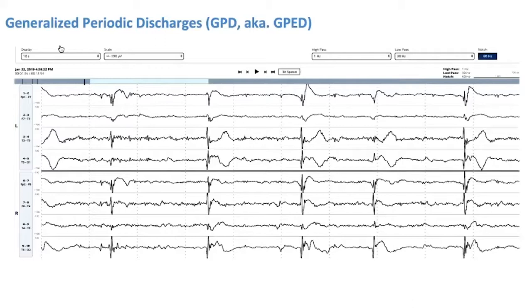It's not that a certain duration has to be met. They're not measurements that indicate one type versus another. It's the stereotyped nature of it. You can see 5 of them across this page. The interval is not as fixed as the other, but that's okay. It's the relative preservation of the interval and the relative preservation of the shape that makes it concerning.